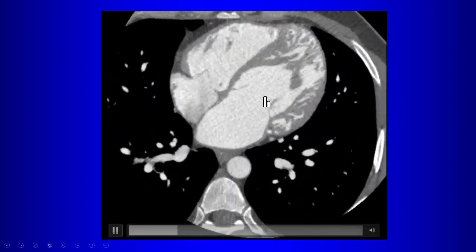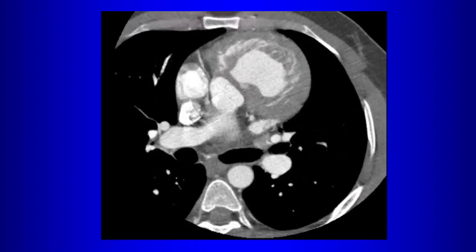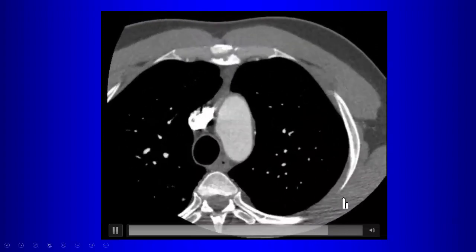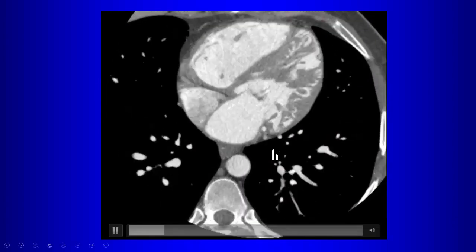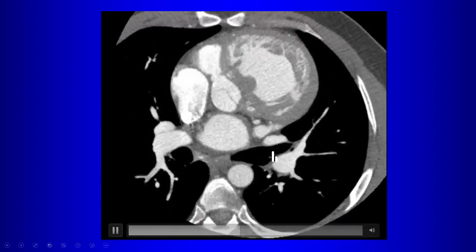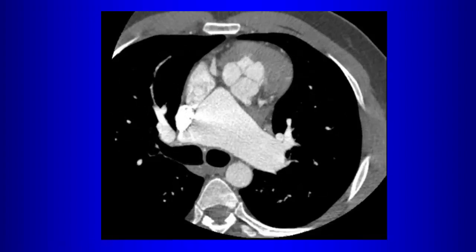So we have these two ventricles here. What do they connect to? Okay, there's no transposition at least. Pulmonary? Well, what is this vessel? Aorta. What is this? What vessel is over here? Pulmonary trunk. What did you say, Jose? Pulmonary trunk? You said there's no transposition. I think there's no transposition.